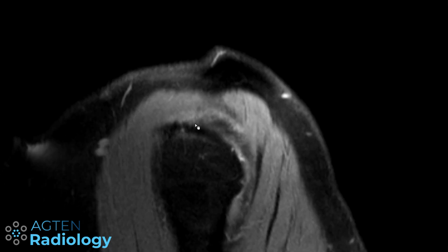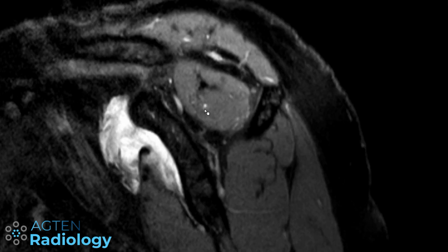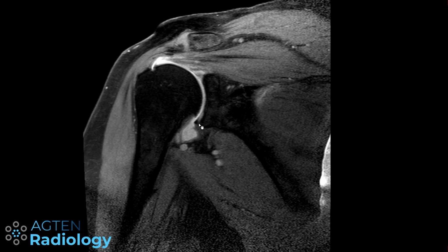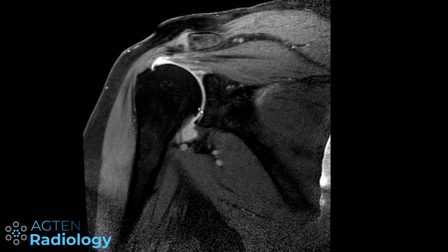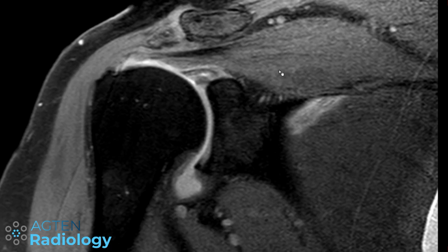This is the tear, therefore we have an articular-sided partial thickness tear with a delaminating component and then extension of fluid through this delaminating tear reaching far deep into the muscle. This here is a T1 weighted fat saturated sequence after arthrography, therefore we have hyperintense signal intensity of gadolinium inside the joint, and you can see that the gadolinium is reaching here into the tear, into this partial thickness tear, articular-sided, and we cannot really see the contrast here in the cyst. But don't get fooled by this, because if you have fluid here and it's like a cul-de-sac, then you don't expect the intra-articular fluid to go in here, because that would need time and to mix these two different fluid components.